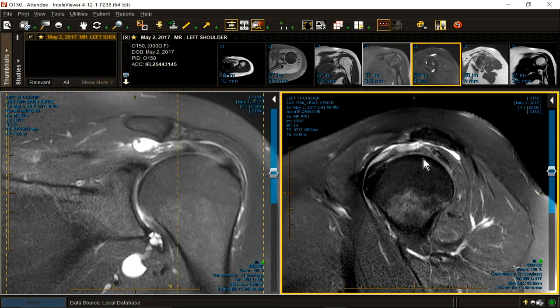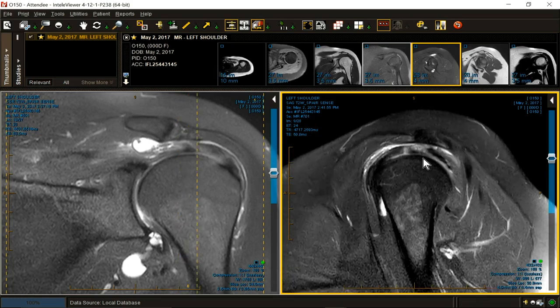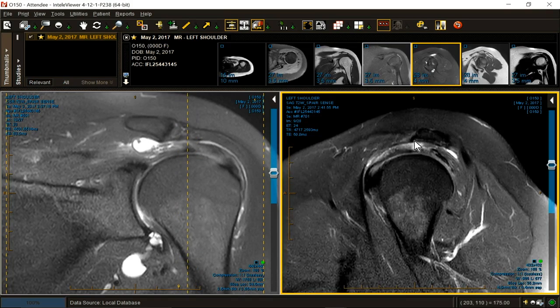So how would the conclusion read in a case like this? Well, we do have a pointed acromion and a thick coracoacromial ligament, so my conclusion would read: outlet-related impingement with acromial remodeling and thick CAL contributing to broad, confluent, footprint tendon fiber failure and confluent tendinopathy, period.